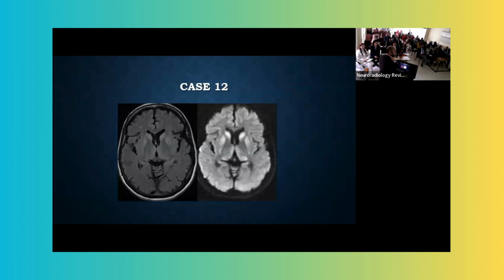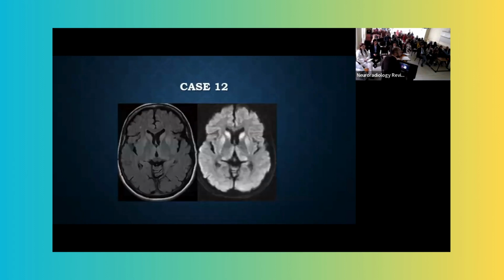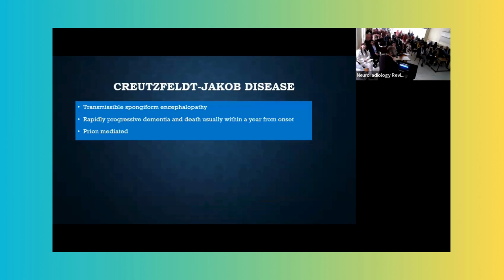So last case, and then I'll finish. We saw a similar case very recently in our hospital. Whenever you see something like this, think about metabolic disease first of all: uremia, hypoglycemia, carbon monoxide poisoning. But because this is an infective talk, this is because of CJD. Basal ganglia and reverse hockey stick sign, or pulvinar sign. Two signs, basal ganglia. Remember those. Is it the genetic testing? No, it's the brain biopsy, the gold standard.